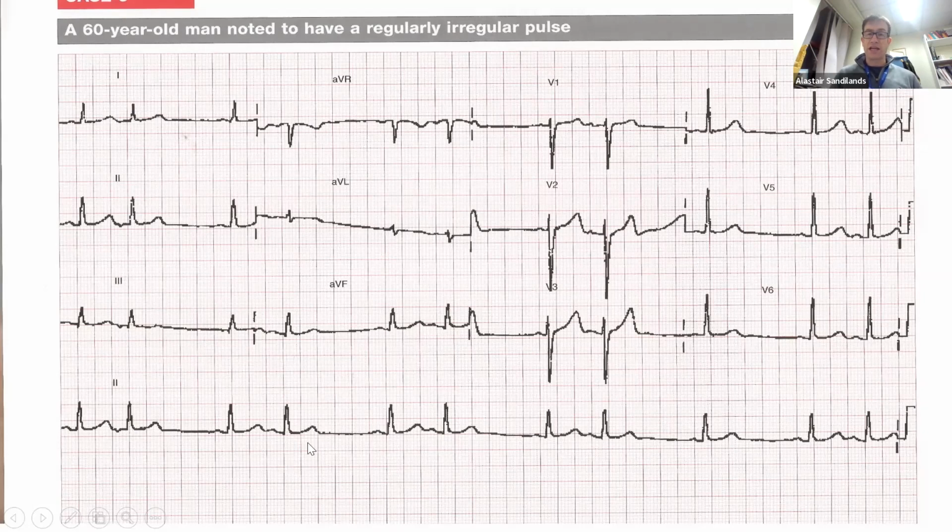Now, if you look along, what is not the same? What can you see that might not be the same? It's the P wave. So now we've got a normal P wave going down to the ventricles, QRST, and then we've got a negative P wave here to the QRS. And then we've got a pause, the heart resets itself, P, QRST, and then a P that's a different shape. That's a different shape to that, but this is a different shape to the negative P wave there. So P, QRST, another pause, P, QRST, another P wave here that matches this one, but doesn't match this one. And now P, QRST again, a P wave that matches this one, but not that one, that's flatter. And normal, just one beat on its own, and then again P, QRST, and then another beat.